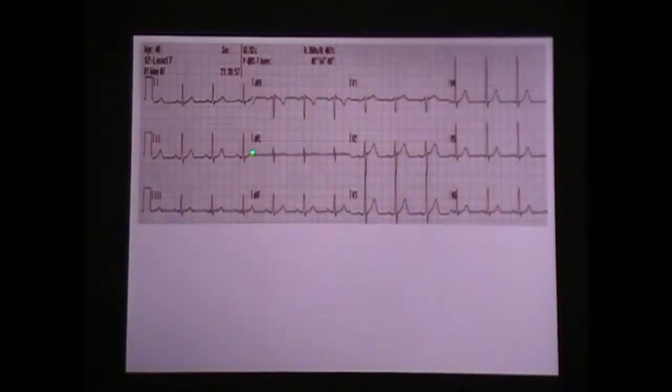As far as ST segment changes on here, we can see a really subtle ST elevation in 2 and 3, which can be pathological. However, we've got some subtle elevation in V1, V4, maybe 5 and 6. So I'd say we have diffuse ST elevation that's really moderate. Otherwise, I wouldn't see anything in here that stands out to me. Everything else is, question, normal.